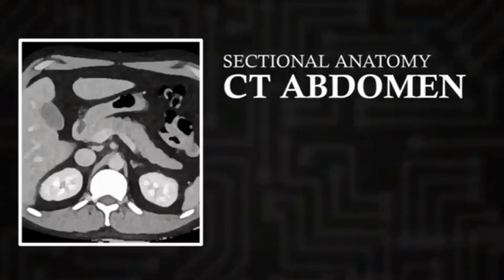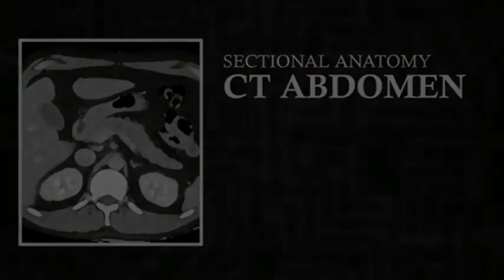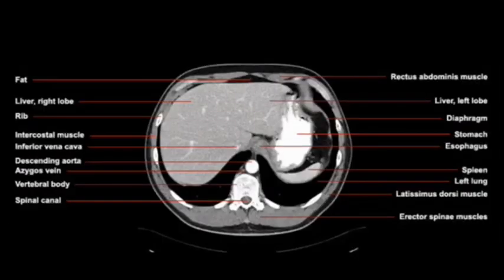Hey everybody, welcome back. This sectional anatomy tutorial is on CT imaging of the abdomen. In this lesson, we'll be looking at the axial plane. In this first slice, we're looking at the most superior end of the abdominal cavity. There are a few important structures that we should be able to recognize right away.